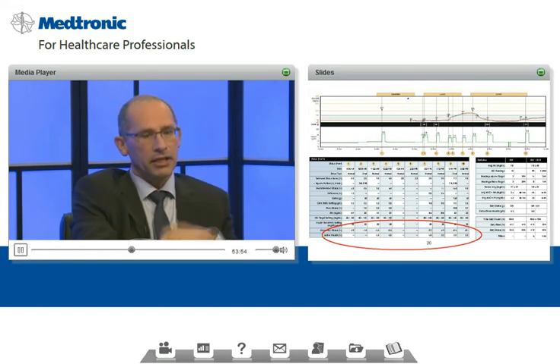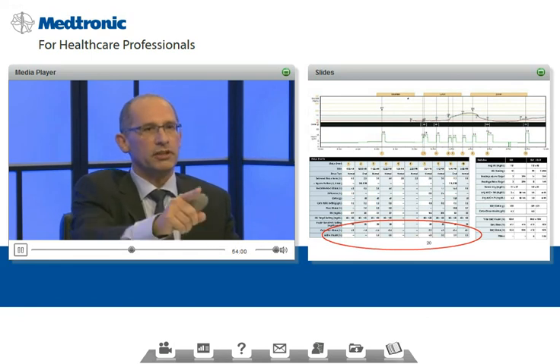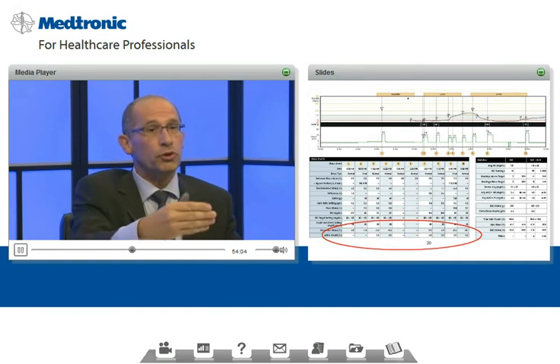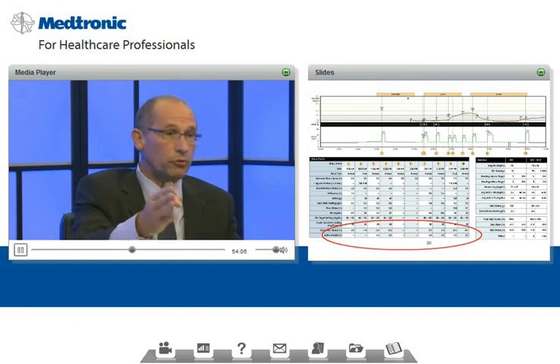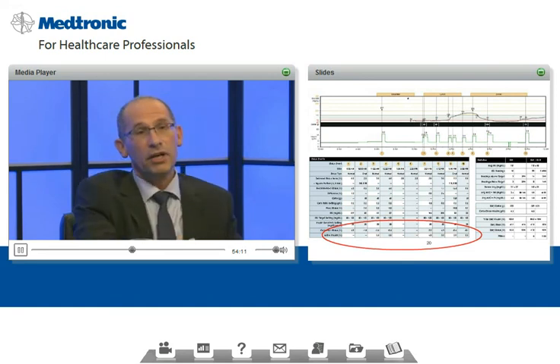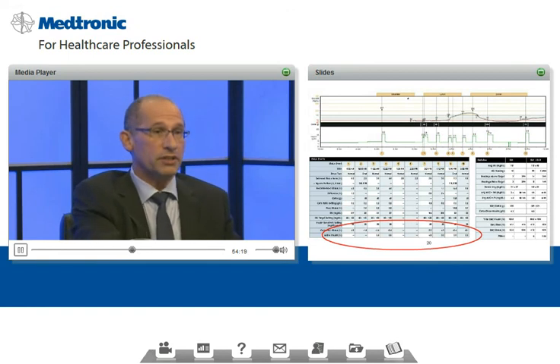And what I mean by that, if you go and look at the lower second line, and that is the correction bolus from each bolus that he did, you can sum up and see that many boluses he needs to do an additional 2.2 units, 1.3 units throughout this day. If you sum up those who are positive and those who are negative, you can get some kind of a notion how far the basal insulin is from his need, or how far the total insulin is from his daily needs.